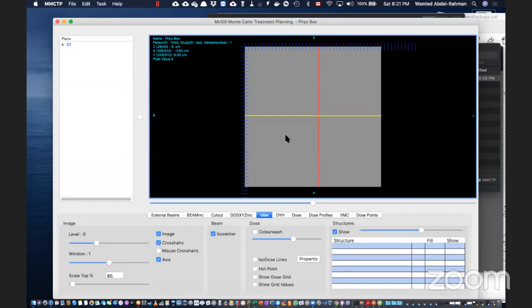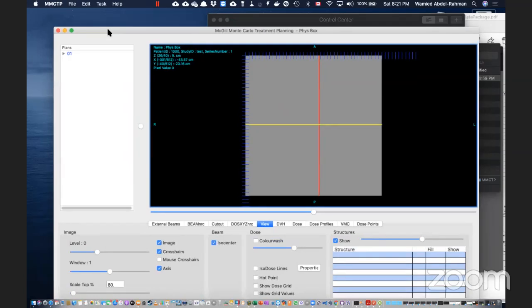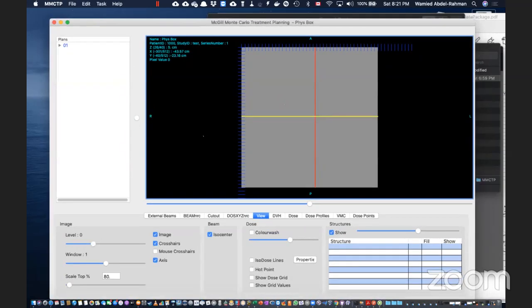How do you actually go to other images? I can't, for example, go to other slides. Other axial slices? Is that what you're asking for? You can do this in Windows. Do you press on a button? It should just be the arrow key. Okay, it does not work on my Mac. Up, down. It's a box. I cannot see it, but maybe I can open a patient. But I saw it working on your Windows version anyway.